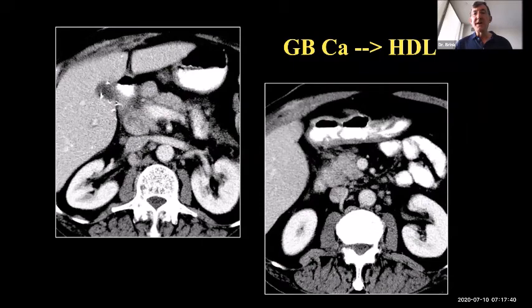Another patient with gallbladder carcinoma, this one's been resected. We see staples in the gallbladder fossa, now with more rounded metastases in the hepatoduodenal ligament, extending all the way down between the uncinate process and the collapsed second duodenum. This is tumor coming down the hepatoduodenal ligament.